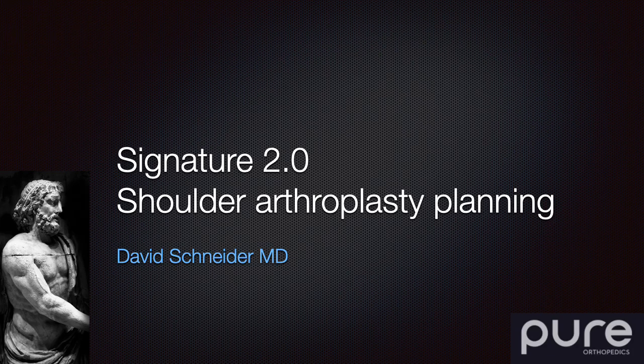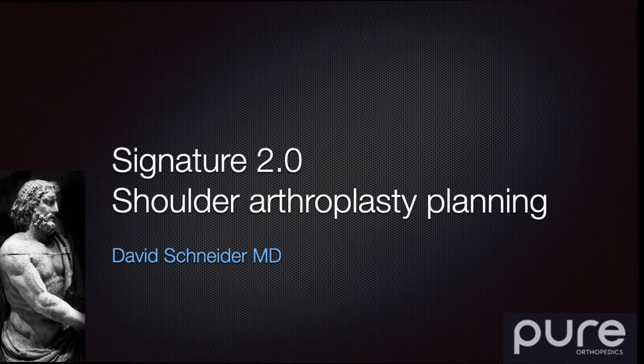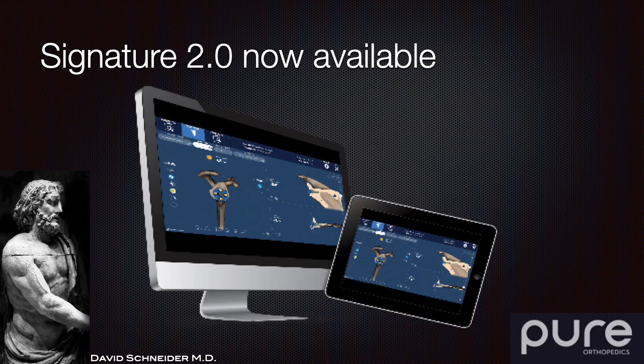I'd like to explain how we do our preoperative templating, our planning, when we're thinking about doing a total shoulder. I'm sitting here in my office tonight, actually doing my templating, and I thought, you know what? Instead of getting dressed in my fancy duds, I'm here in my sweatshirt. I'd like to show you how it actually works.